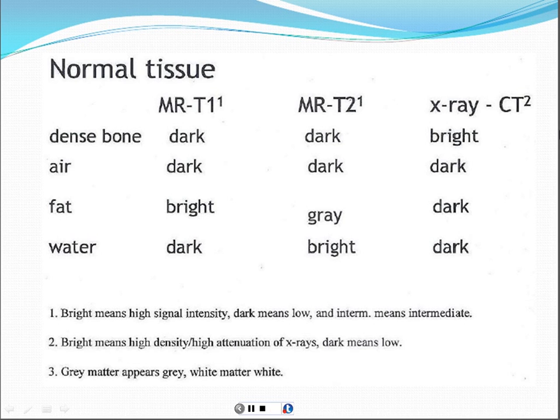All right, so this is just going over some general characteristics of T1 and T2 weighted imaging versus CT, which I think you guys are probably pretty familiar with by now. I'll tell you in general, if you're looking for things that are bad, something that's intermediate on T2 weighted imaging is usually going to be suspicious and dark on T1. So that's what we're often looking for. Stuff that's usually really bright on T2 is not too bad, and really dark on T1 is not, but that intermediate zone starts to make you worry.